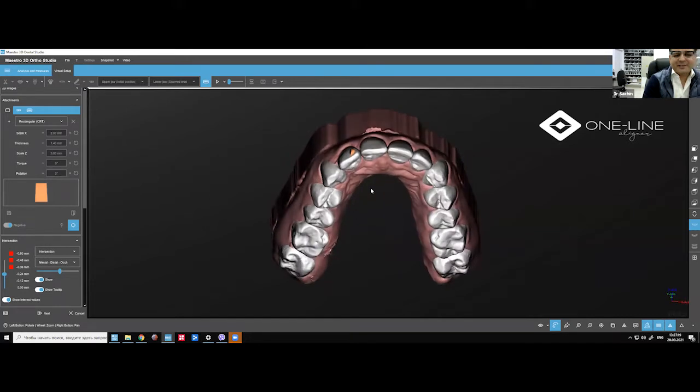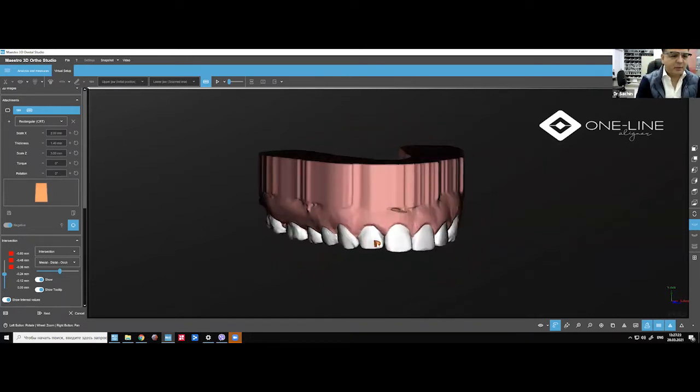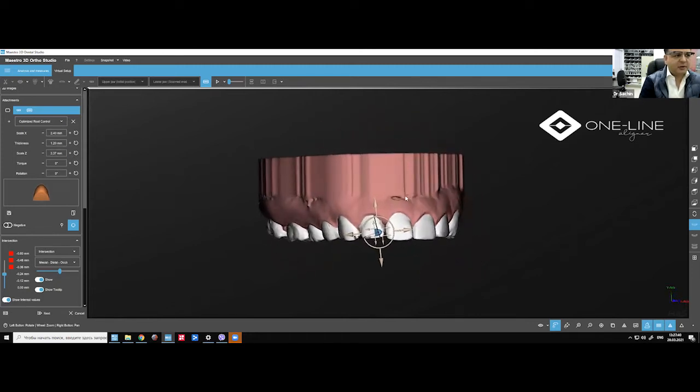Okay, what size now? Let's talk about the size. This is the size which we have right now. It's a 1.1. We can have a 1.2. The x-axis will be, in this case, the vertical axis, particularly when you hold it like that, and then the z-axis, you can just grow a little bit. This is good enough. So you can just note down 2.4 for the x and the z-axis, and the thickness around 1.2, if you want to go for rotation on smaller teeth.